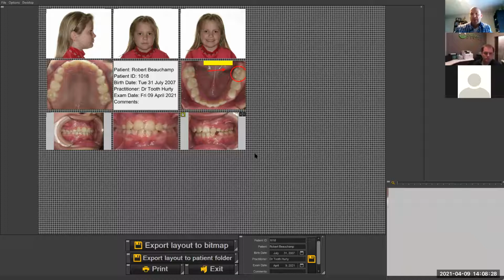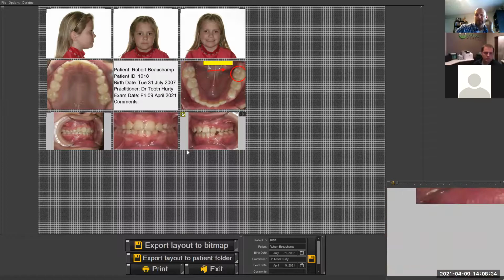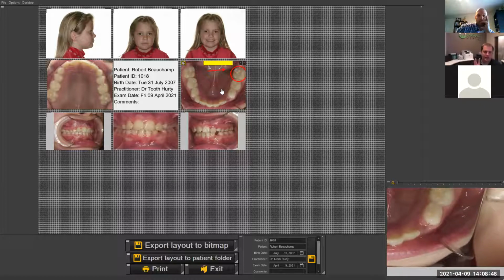So to expedite the picture taking, you can just quickly tweak it, crop it, center it here, and then you can save it in the format that you'd like. So you could do this also for those digital camera shots. You can't rotate them though. You can just kind of move them and magnify them.